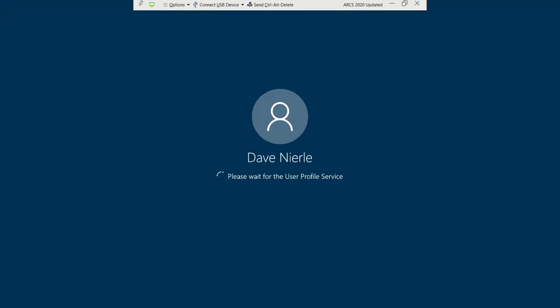And once it is set up, security, software licenses, desktop is set up, apps are loaded, you'll have access to the data. And in this case, you'll be able to use your USB plugs. If you have that Holter device in your hand, it'd be much quicker and easier to move data to the cloud for analysis. So we'll give it a little bit more time. And it'll be the same sort of steps using ARCS on a PC. The logout steps are a little different, but very straightforward.